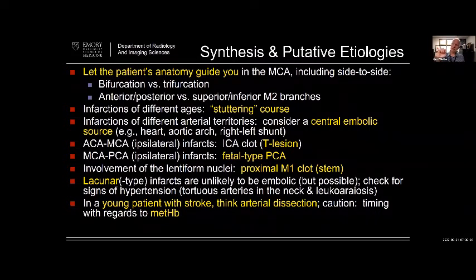That's why it's nice to look and see if you see what looks like, for lack of a better expression, a little ghost of a branch vessel that's thrombosed. So if you're doing a catheter angiogram, you don't have that ability to see, you just see the absence of it. Maybe if you notice it's not there, see a gap. But of course, if somebody has parenchymal infarction, you can kind of trace it back and see, does that fit?